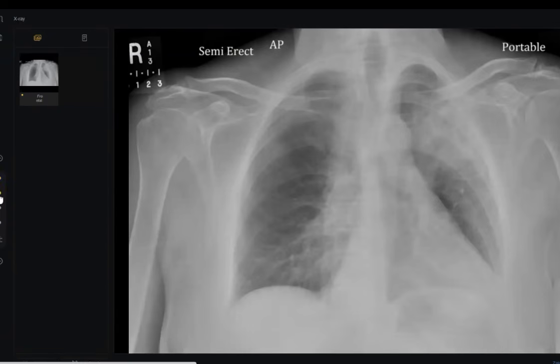But you did well, really, here. Number two here, very nice pickup, but it is better to tell the doctor the opacity, because really we can't judge 100% whether this is a mass or pneumonia. So better to tell opacity, left upper zone opacity. Doctor, the first three segments of the left three ribs are obscured. Could you change the window? Because if we have windowing here, you will see the ribs clearly. But at least you can use the term obscured anterior segment of upper left ribs.